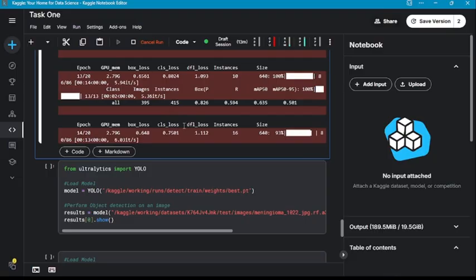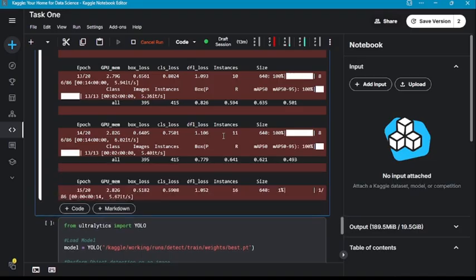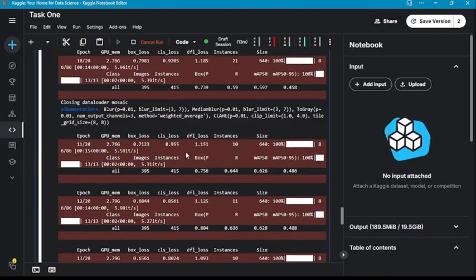The dataset gotten from Roboflow is already split, since we're using a pre-trained model, so it has the training set and its test set there separately.